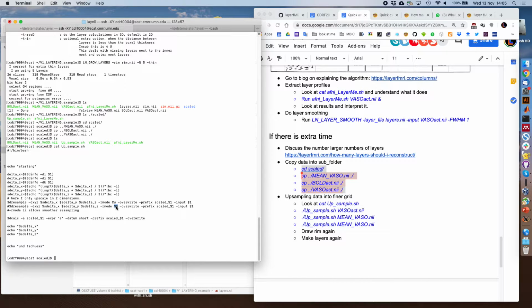Yesterday, Jonathan talked about Peter Koopmans' way of analyzing things, where if you plot a line over here, you have kind of a step function, which would assume that the voxel is homogeneously filled. So some people think this is the most conservative way of thinking it, that a voxel is homogeneously filled with a value. I don't think so.